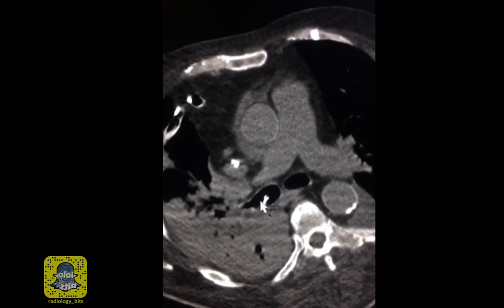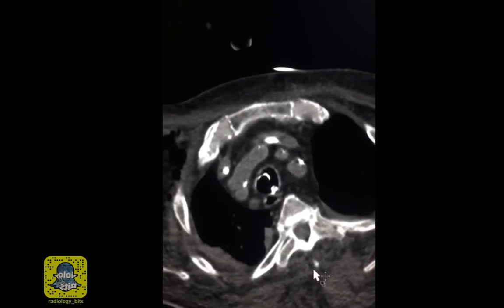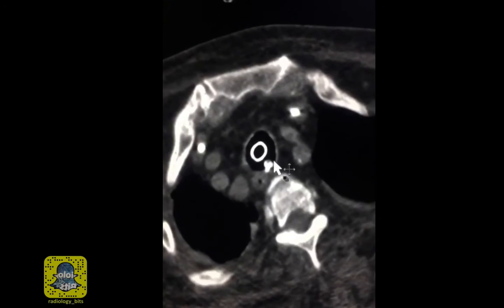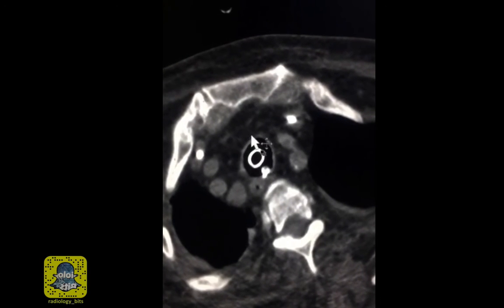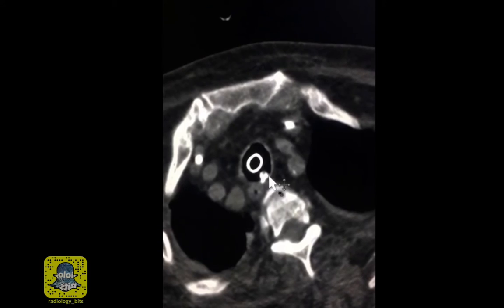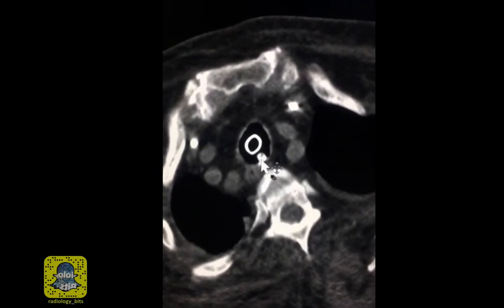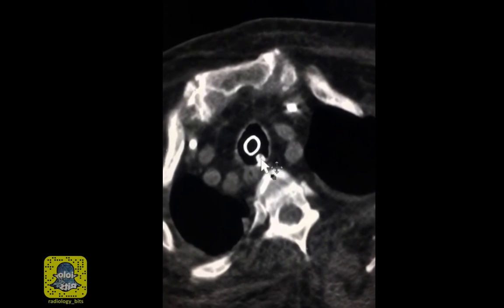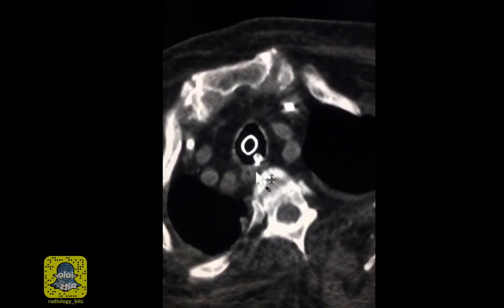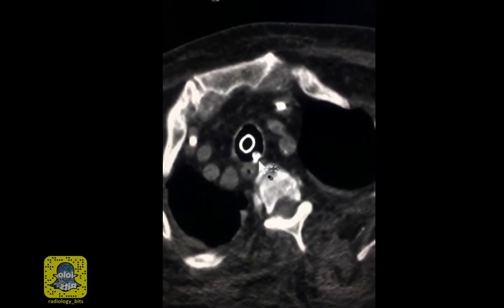You see the tube within the lumen of the right main stem bronchus and within the trachea. And here's an image higher up. This is the air-filled tracheal lumen. This is an endotracheal tube, and this is our abnormal tube running beside it. This tube is actually a nasogastric tube that was intended for esophageal intubation. The esophagus is here. And now the story is clear.